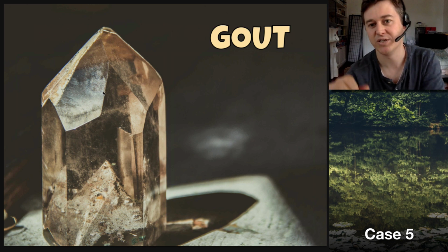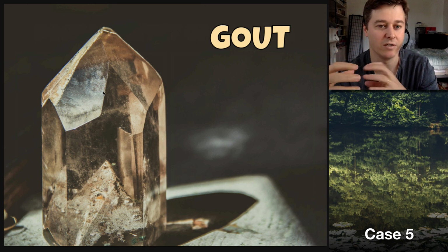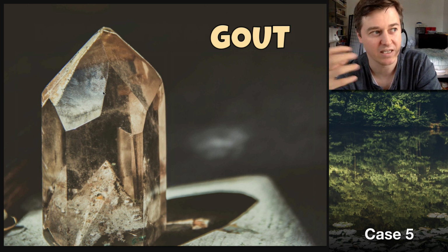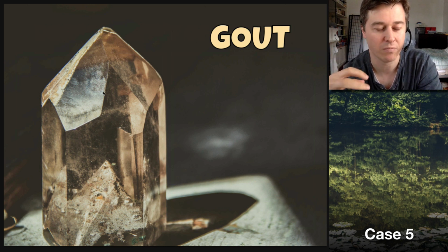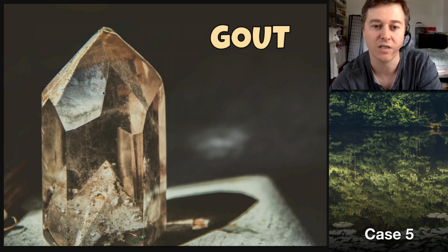And then the other thing I would mention is gout. Gout deposition around the quadriceps tendon or patellar tendon can quite commonly cause a lucent, punched out erosion of the patella itself. So if you're seeing a lucent lesion of the patella, don't forget that maybe this is actually crystal deposition around the patella itself causing the apparent lucent lesion.